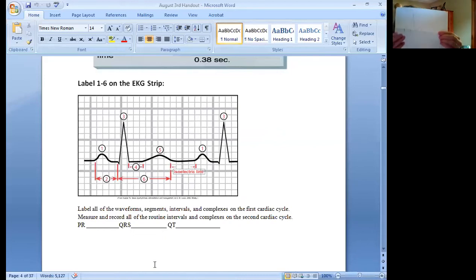Voila. You see how I mark those lines? Well, now what am I going to do with those lines? I'll show you. I'm drawing a little box.